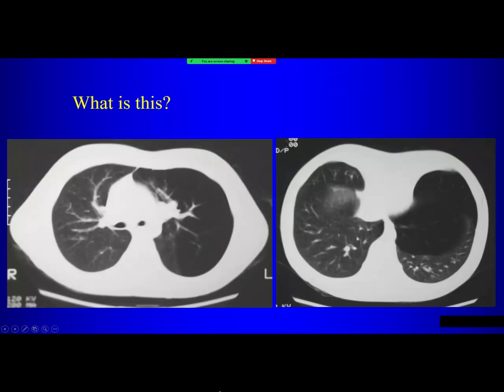Well, here's the CAT scan in this case. So what do we see on the CAT scan? And what do we think is going on here? A large bulla? Well, there are markings in here. You see vessels and you see markings in here. There is emphysema, right? Certainly it's hyperinflated. There is emphysema there. So what is this? What is going on in this patient?